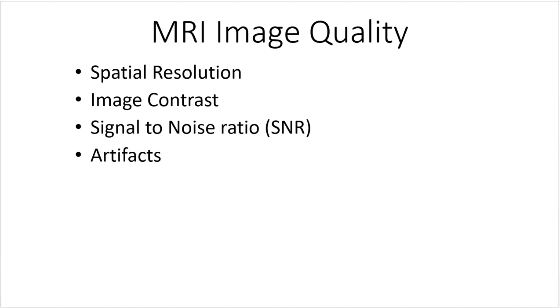Hey everyone! Last week in the CT image quality lecture we talked about how to view CT images. CT images and MRI images look almost identical. Most people, until you get really good and used to looking at these type of images, would have a hard time distinguishing between a CT image and an MRI image.